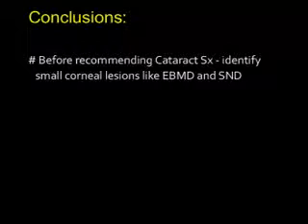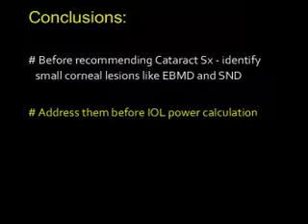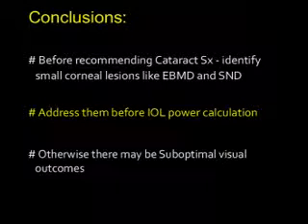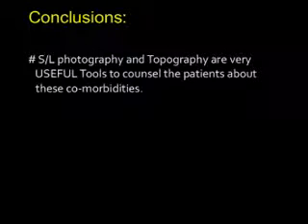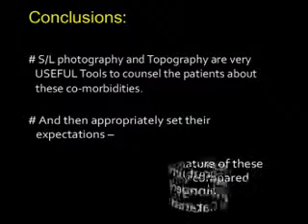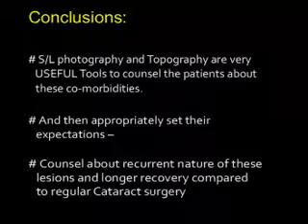In conclusion, before recommending cataract surgery, identify these small surface lesions like EBMD or SND and address them before IOL power calculation. Otherwise, there will be surprises with suboptimal visual outcomes. Slit lamp photography and topography are very useful tools to counsel the patient about these comorbidities and then appropriately set their visual expectations. Counsel about the recurrent nature of these diseases and longer recovery compared to routine cataract surgeries.